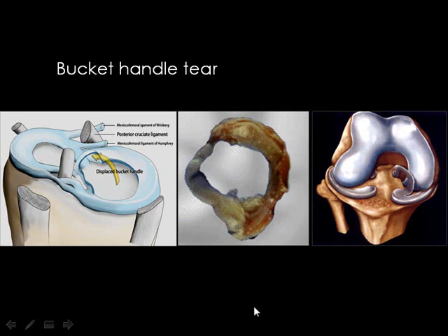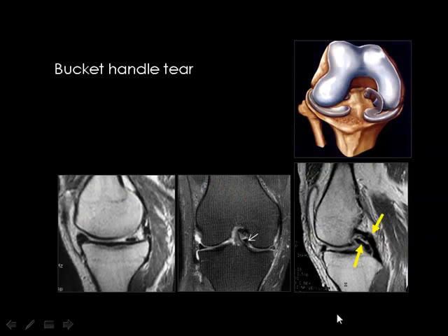How can you see this in imaging? If a part of the meniscus is torn, then what do you expect on the remaining part? It will be small. Okay? You remember that the posterior horn of the medial meniscus is larger than the anterior horn. Okay? Then if you have an MRI and they see that the posterior horn is smaller, then you know that a missing part of the meniscus is present. Okay? You understand?